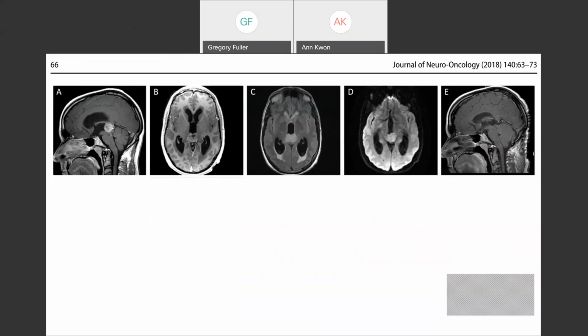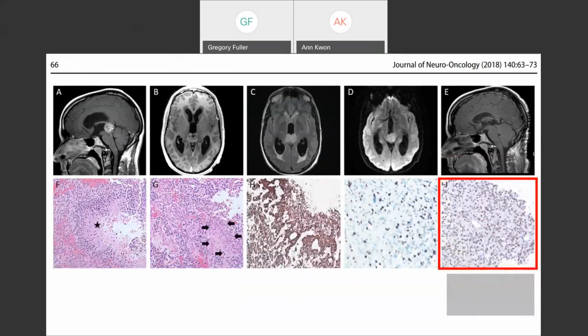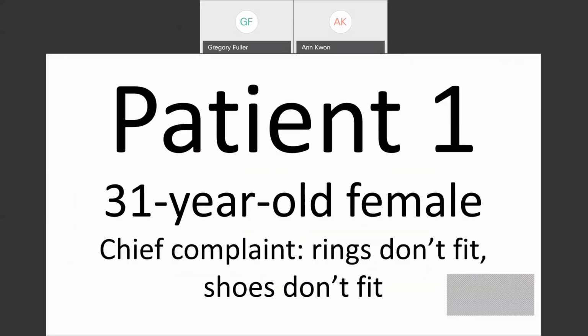And there is the histology, and on the far right is the H3K27M mutation. I know that the one report I'm not showing you that came out before ours was, I think, a series of 47 cases by Tarek Tehan and Ari Perry at UCSF, and one of their cases was a legitimate pineal H3K27 mutant case. All right, so it's real, bottom line.